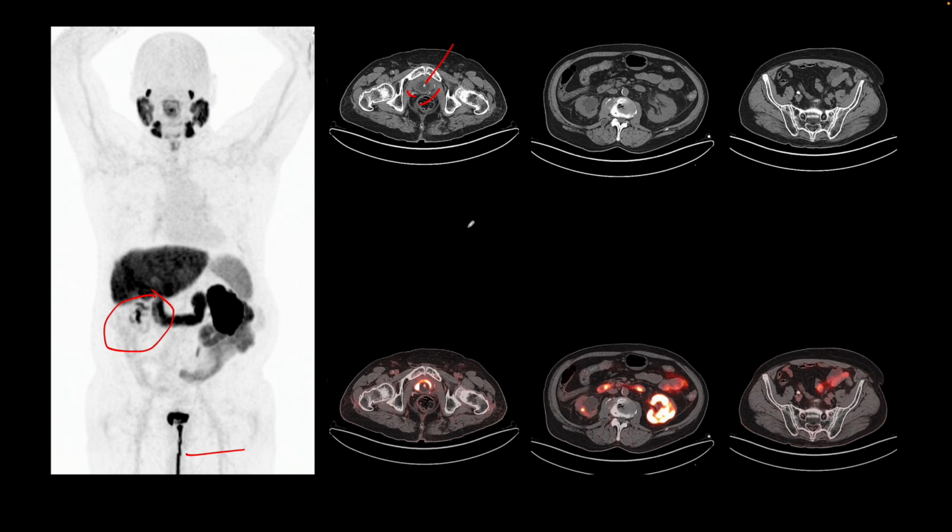a nuclear medicine physician, and this is a good example of the findings that may be missed by nuclear medicine trained only physicians with no or not much radiology background. And so I gave you a hint about this finding before. On the cross-sectional images, the right kidney shows hydronephrosis, and because of that there is less uptake and excretion of PSMA, and more inferiorly there is an obstructing stone.